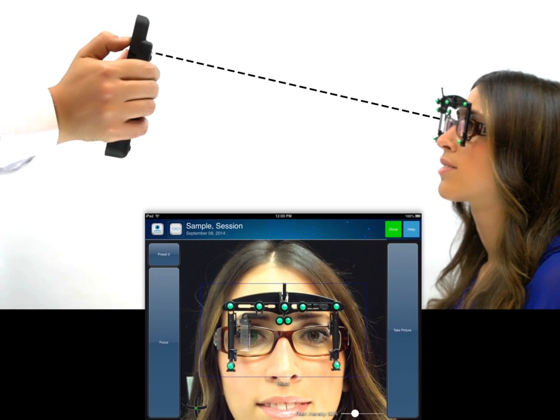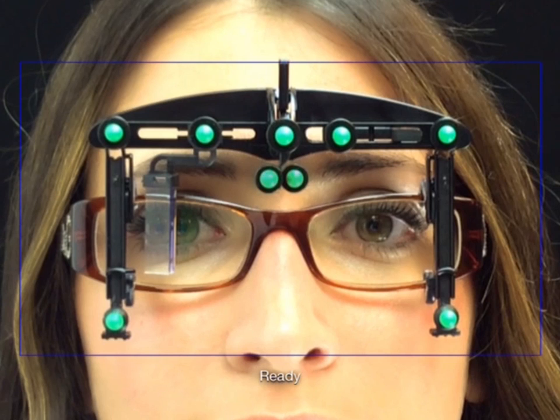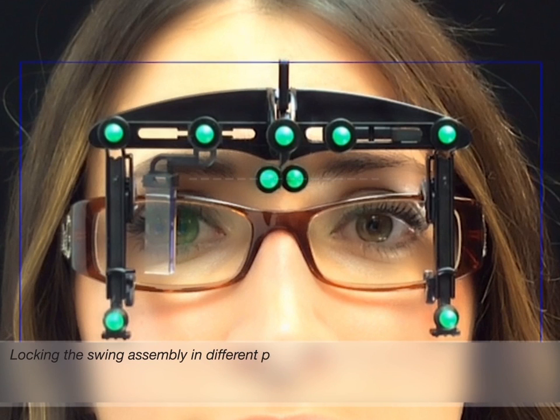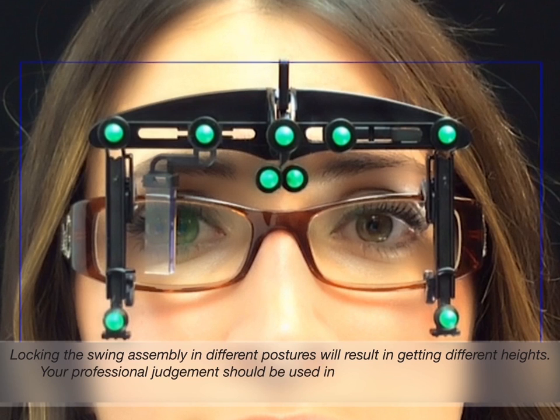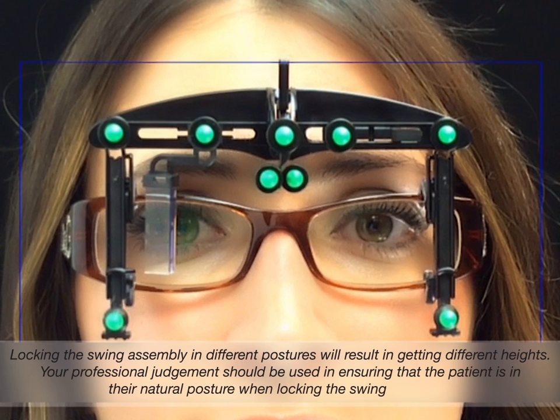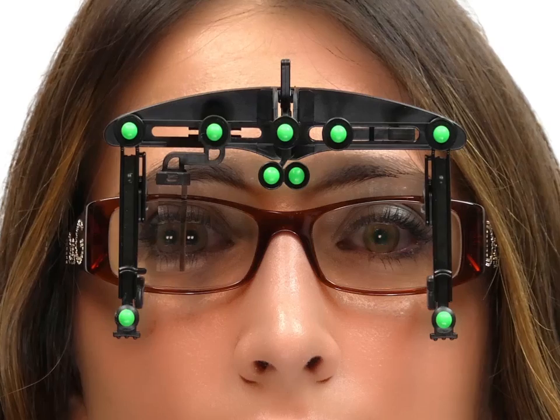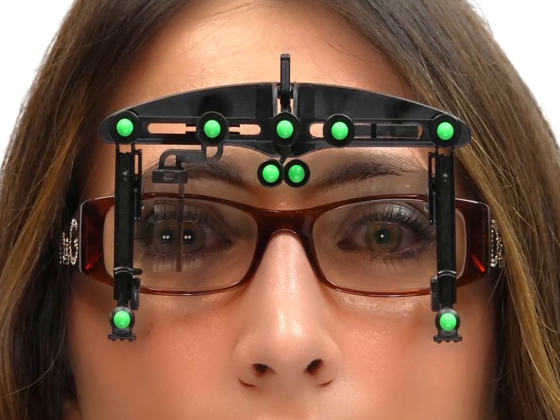The patented EY stick ensures precise measurements by recreating the customer's natural posture when the two green nasal sensors are in alignment. Note that locking the swing assembly in different postures will result in getting different heights. Your professional judgment should be used in ensuring that the patient is in their natural posture when locking the swing assembly. Now that the EY stick has been set, you are now ready to take the measurement picture.